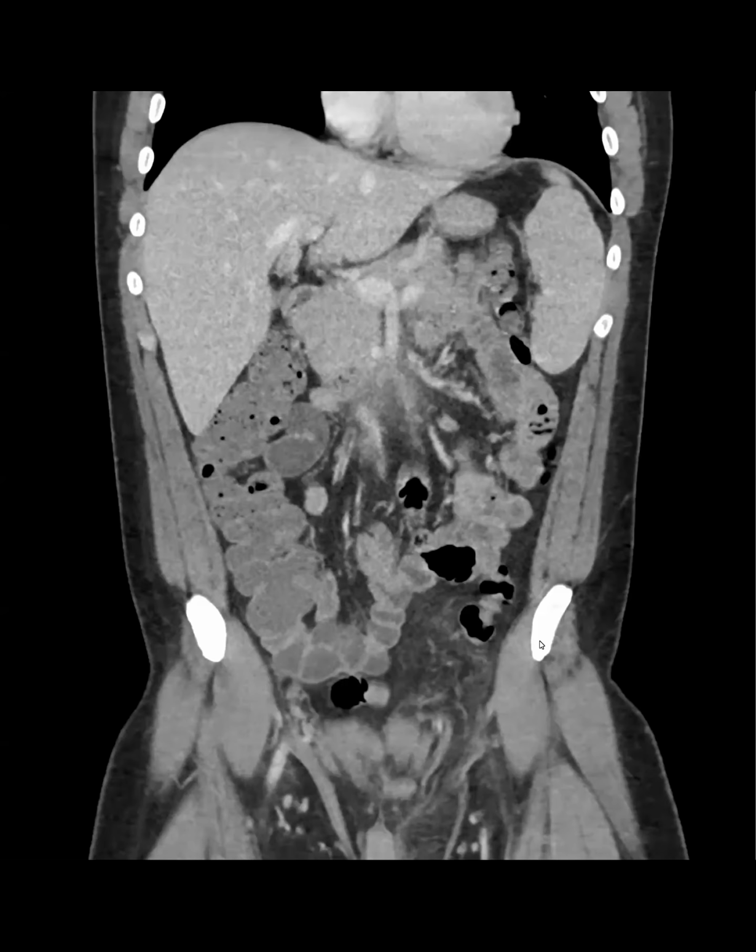Right. Neuroendocrine was my thought too, because those can happen in younger ages. We thought of SPEN for a minute. He was young, but those are still more in the tail. They can look heterogeneous like this. So for primary pancreatic things, those were the two things we thought of, and that was the differential we gave. But one thing about SPEN, when it's not enhancing centrally, it's usually from hemorrhage, and so the T1 not having hemorrhage in it is a little bit against. Okay.